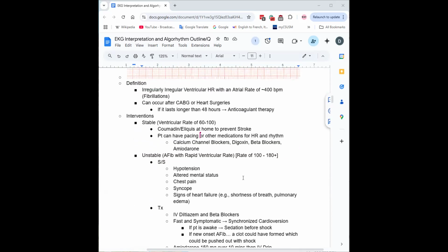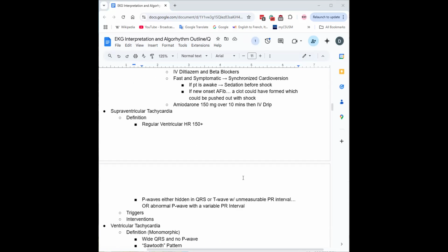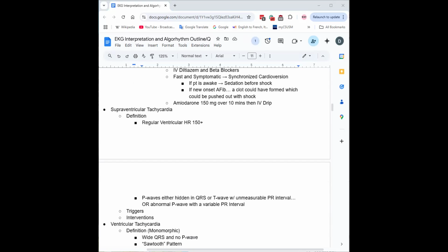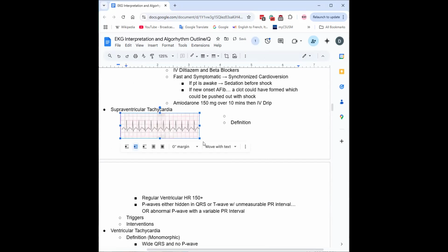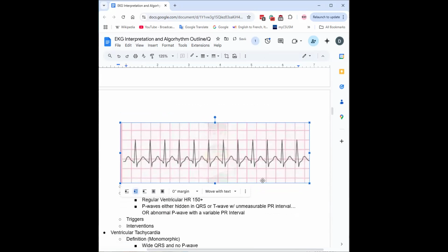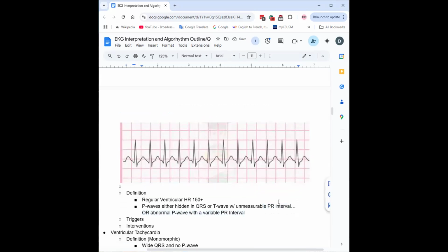Okay, cool. So now we have SVT, which I can get a picture of here. Boom. Oop, how did that happen? Why is it doing that? Okay, that's better. I don't know what you did, but good job. Here's a picture of it.